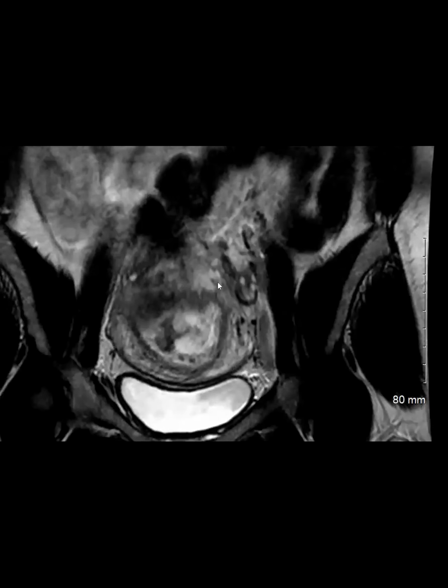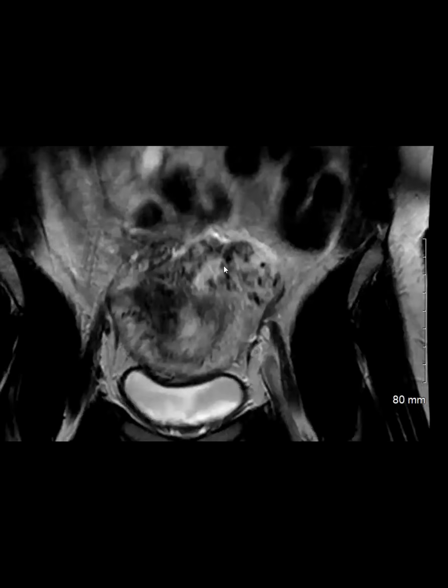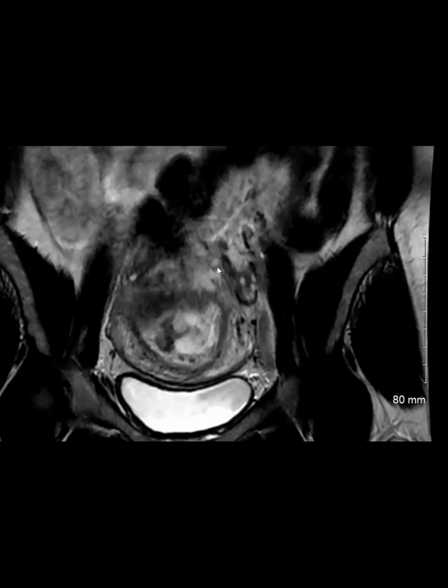Angular is not in the fallopian tube or cornua, but it's still in the uterus, just at these two corners of the uterus, so to say. And then, yeah, it's important to distinguish interstitial from angular, because interstitial gestations are close to the uterine artery, and if these rupture, they can cause torrential hemorrhage and can be life-threatening as well. So I just thought this was an interesting MR appearance of an interstitial ectopic pregnancy.